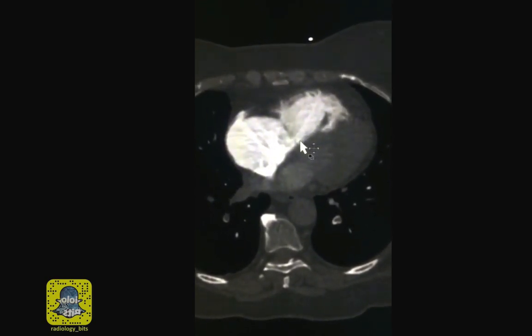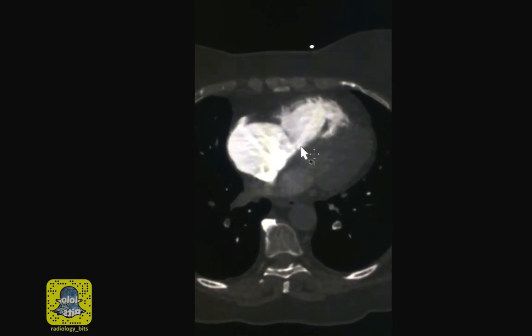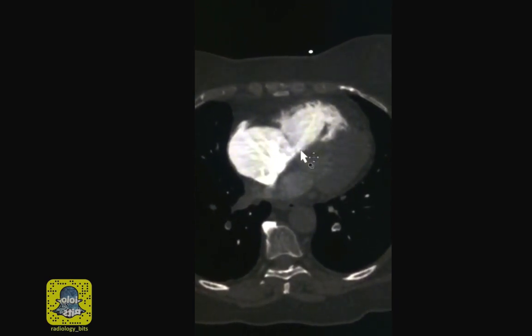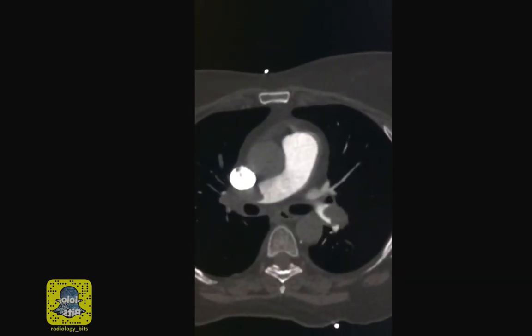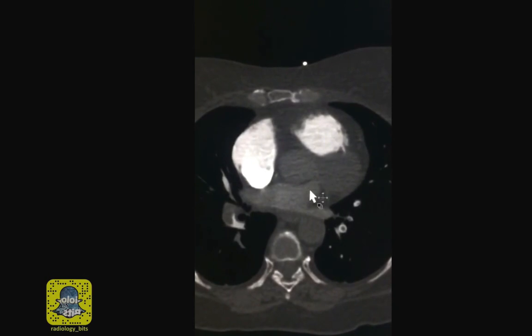If you're reporting such a case, these signs are very important. That elevates the seriousness of the case to another level, since the combo of acute pulmonary embolism, especially of this large size, with right heart strain denotes poorer prognosis. What we commonly see in radiology practice is that radiologists would report the pulmonary embolism, but would not comment on all these signs of right heart strain.